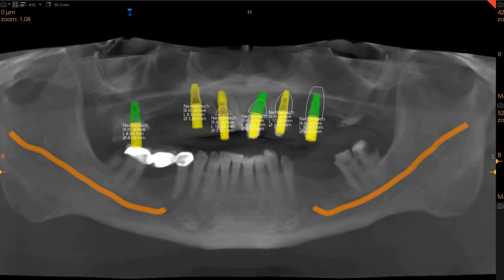These are all the areas where there is a possibility of implant placement. Until and unless bone augmentation is performed, all the implants will require further bone augmentation, and the areas where ideally we want some bone are around the premolar region, so all on 6 can be given.